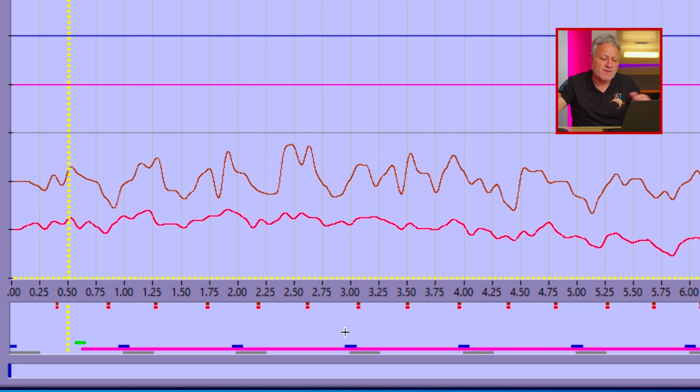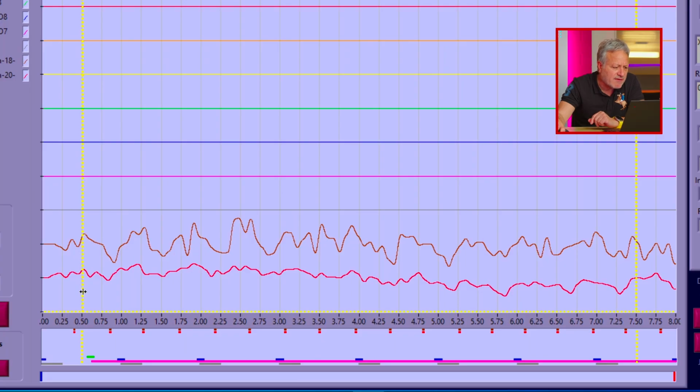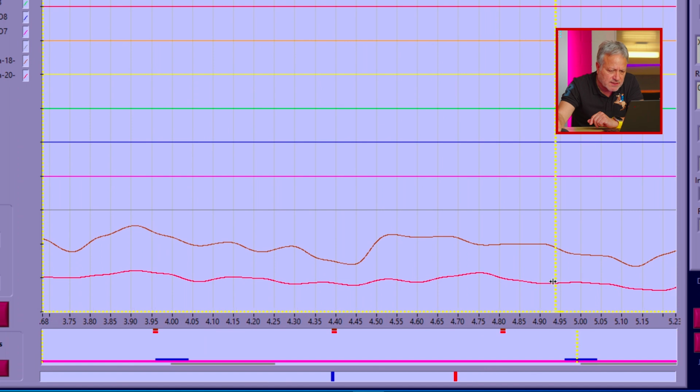So beautiful. Here we have the trigger marks 1 and 2, which is a marker 3. Obviously, trigger bit 1 and 2 is a marker 3. That was presented every, we can measure the time delay of those. So if I just pull that a bit together like this, I can say, okay, how long was the trigger interstimulus interval?